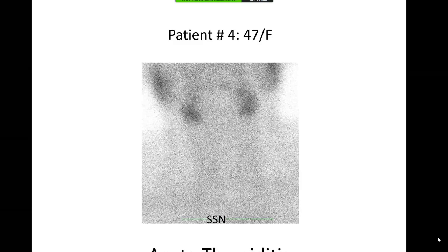So basically, we can say this is thyroiditis. That's probably when you remember when it was called Hashimoto's. I said we just call it a thyroiditis rather than putting a prefix. What kind of thyroiditis? Because we cannot make that distinction solely on the basis of a nuclear scan.